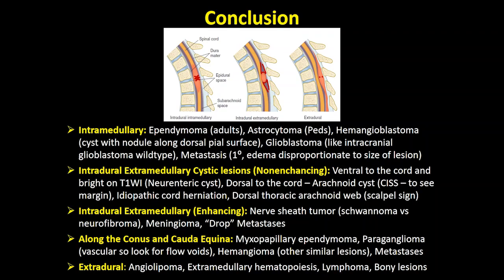If the lesion is extradural with imaging features that I described earlier with fat and enhancement, consider angiolipoma, or otherwise you have certain other bony tumors that can occur in this particular location.